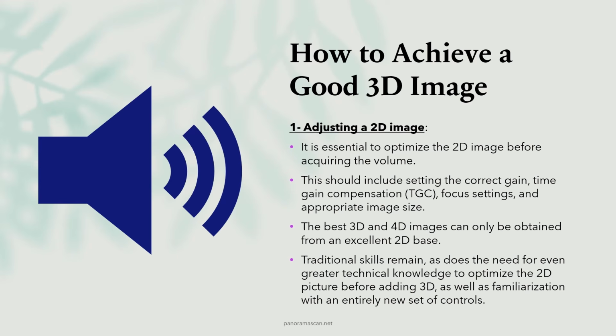For example, understanding how to adjust the sweep speed, volume box size, and slice thickness is crucial for controlling the quality and resolution of the 3D data. These new techniques build upon traditional ultrasound skills, but they also require new knowledge and practice to use effectively.